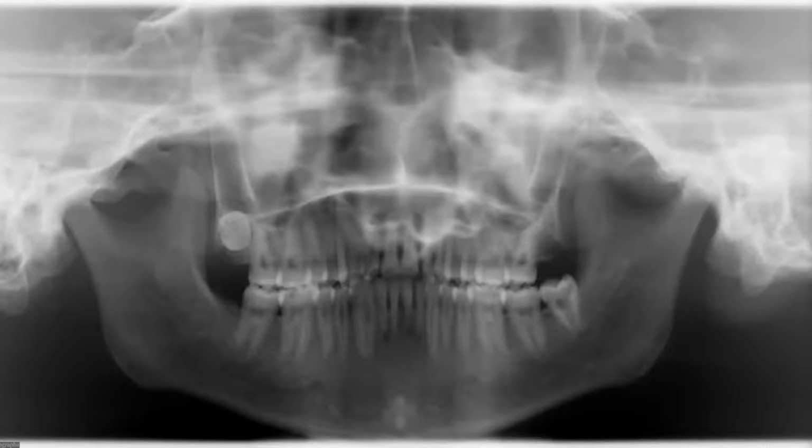So this is an image of a phantom, a skull. The skull is covered in plastic, so it was not possible to put a bite block. Without the bite block, the posterior teeth are in occlusion. We have just moved this phantom too far anterior in the panoramic machine. Now we see that the anterior teeth are narrow. See the size of the mandibular incisors? These may look like matchsticks.